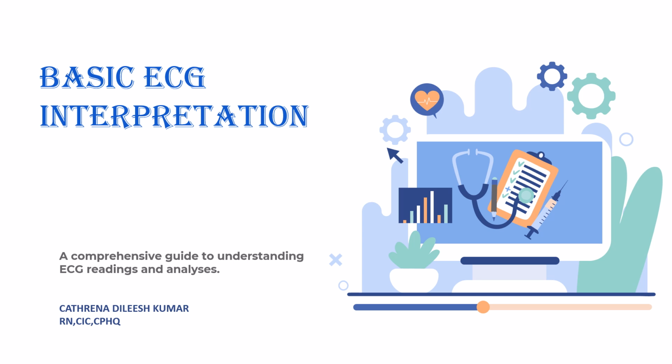Today we are going to discuss the most awaited topic, that is basic ECG interpretation. When we say basic, I mean only the basic. I'm not going into details about each condition, each arrhythmia, because each arrhythmia has its own way of interpretation. Do not misinterpret or think it is advanced. So we are only going for basic ECG interpretation.